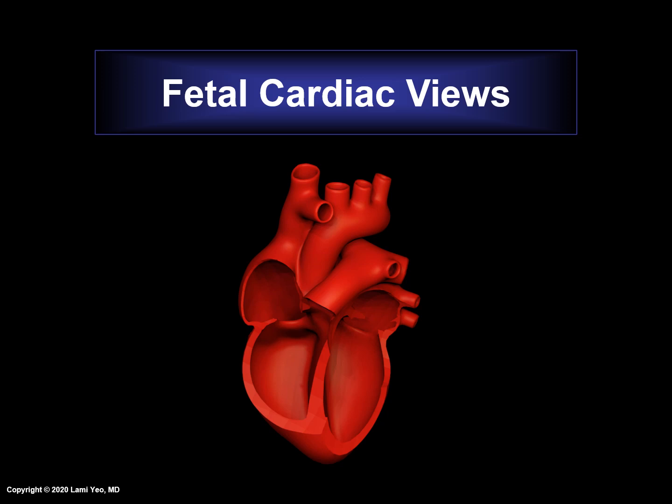This lecture will review the normal characteristic features of fetal cardiac views on ultrasound. Specifically, we will focus on the 9 cardiac diagnostic planes automatically generated by the Fine method. Our intent is to help sonologists understand normal fetal cardiac anatomy in general.